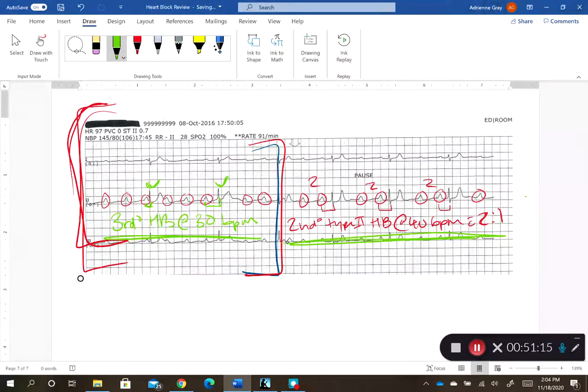So crazy how much could happen in just 15 seconds, and we really had to sit down and look at this and kind of take it apart piece by piece to really figure out what's going on with this patient. What happened to this patient was she was really young. She was in her 30s. She got admitted to the hospital to have a pacemaker implanted.